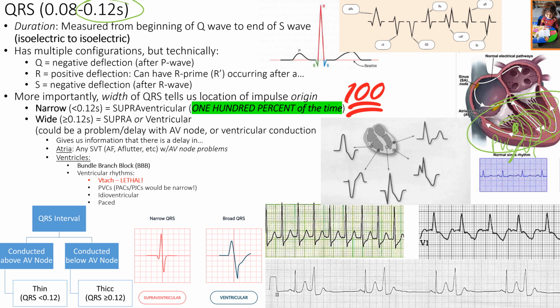And yes, the QRS has different morphologies. They can be just an R wave, like I mentioned, just an S wave, just a Q wave, just a QR, just a RS. There are different variations. I'm not going to test you on that. There are different ways to figure it out, right? But it's not always going to be textbook Q first, then R, then an S, right? They can have differentiating looks to them, okay?